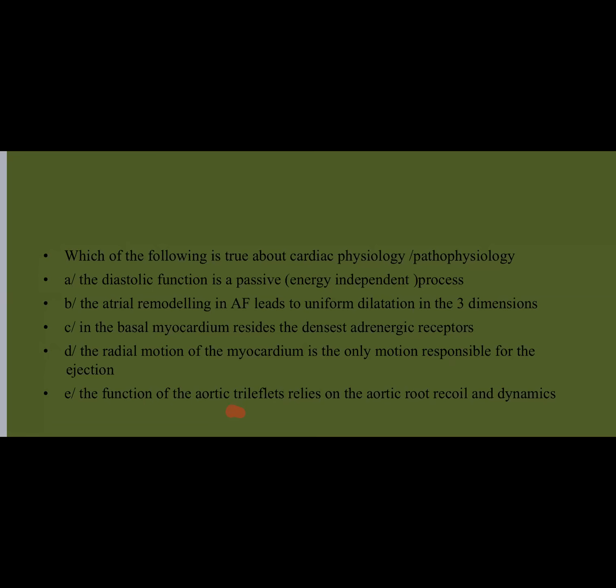So you remember that by echo we used to measure the LA size from the parasternal long axis, right? And this is the anterior posterior. This is the dimension across which the left atrium minimally dilates, because it is restricted anteriorly and posteriorly.